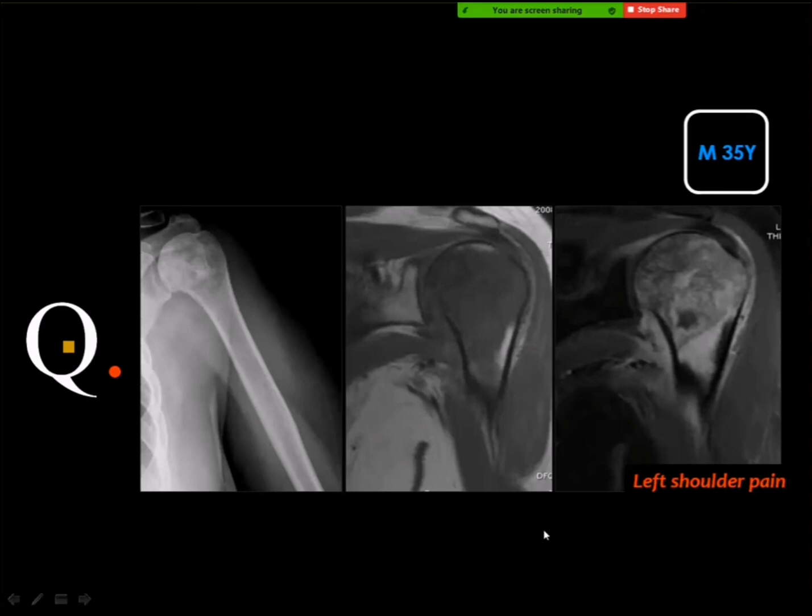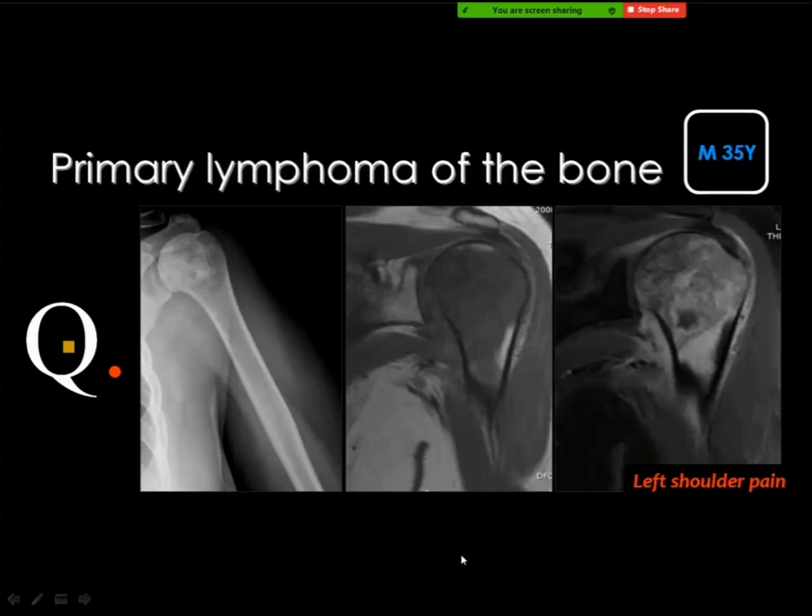Leukemia, lymphoma. Yes, very good. And this is lymphoma. Whenever you are confronted by a lesion which has the malignant criteria, you think of three possibilities which are commonly put in the differential diagnosis. Number one, a primary bone tumor characteristic for this particular bone and the age of the patient. Number two is lymphoma.